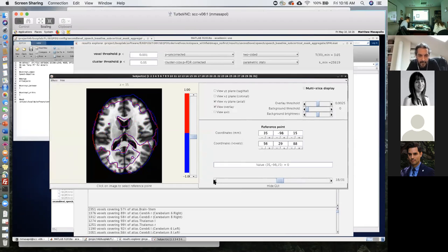So what are these outlines? These are the borders. I mean, it's a technical thing. These are the borders between the regions. I cannot put a zero value in here that I would like. These are the borders between the regions that are above this threshold value and below, and the color indicates whether they are into negative or into positive values. So they are very close because I cannot get this to exactly be zero. They are not exactly the mask, but they are as close as I can get it to that value.